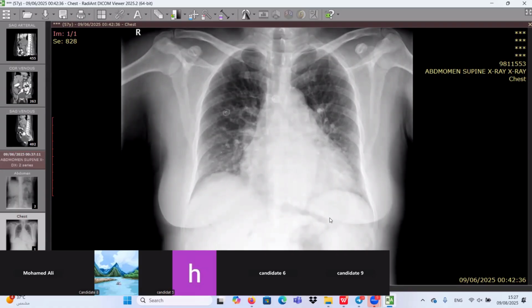Diaphragm. Okay. There is lucency in the central diaphragm. It looks like bowel, but I think it's just an artifact. Okay, so I can't see any more. Do you have any more abnormalities, or any more findings in the subdiaphragmatic region?